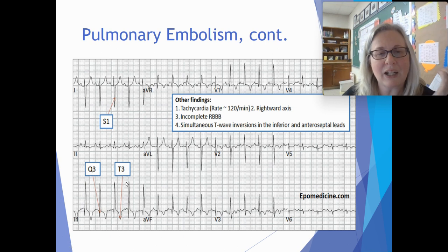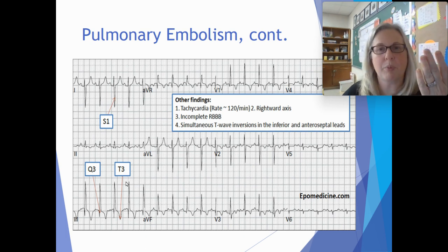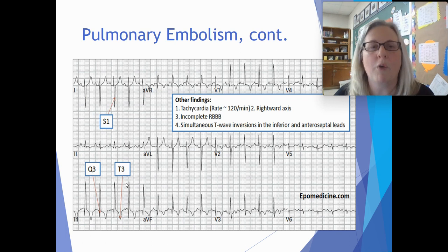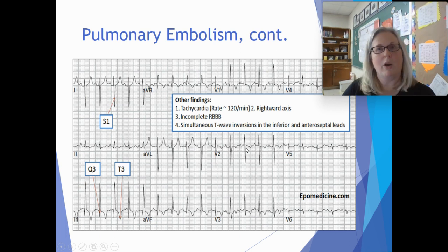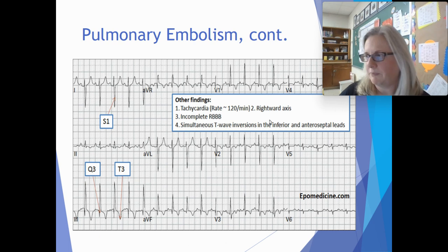We also notice that it's tachycardic, right? So that also gives us another clue. So there's 4 clues there that this is probably a pulmonary embolism and not a heart attack. So we would go forward with a chest x-ray and take a look at the lungs. It's a pretty good indication right away without having to do an x-ray. Just do a quick little 5-minute EKG and we're like, wow, I think they have a pulmonary embolism. The faster we get to it, the faster these people are going to be safe and they can do whatever they need to do to rectify that, okay? So tachycardic also is about 120, 125. All right, pause again if you're not quite sure and go back and watch.